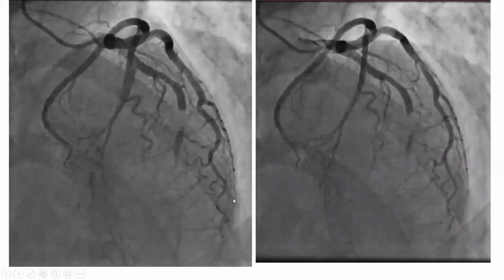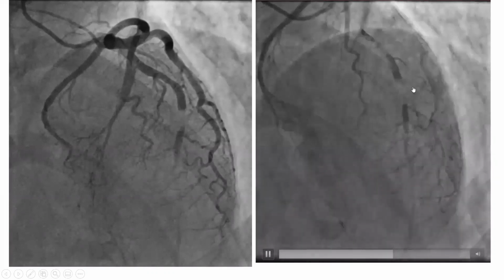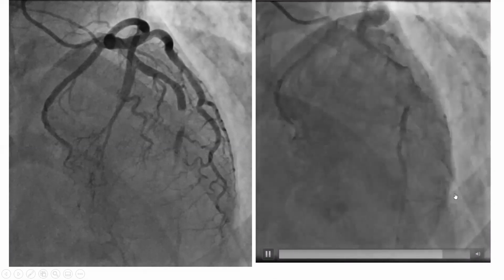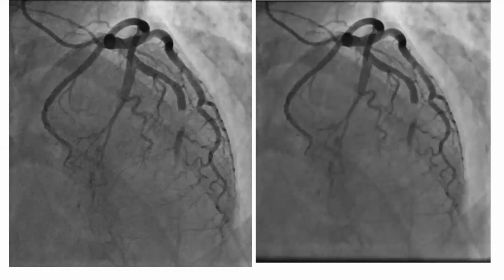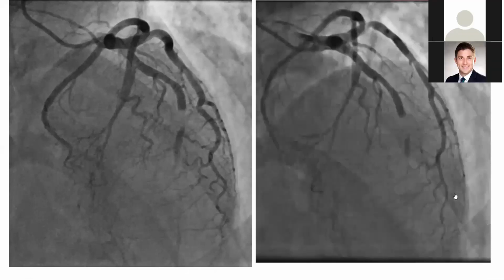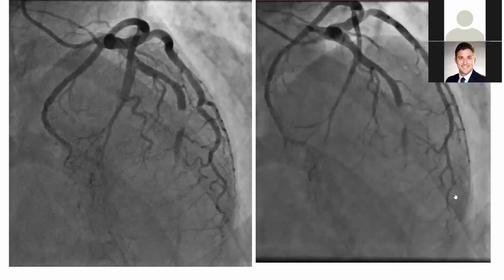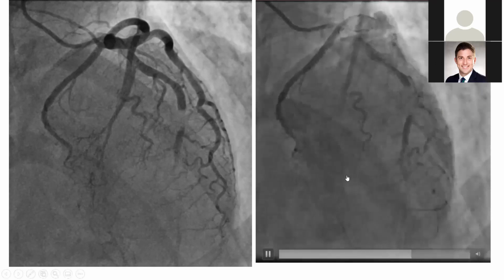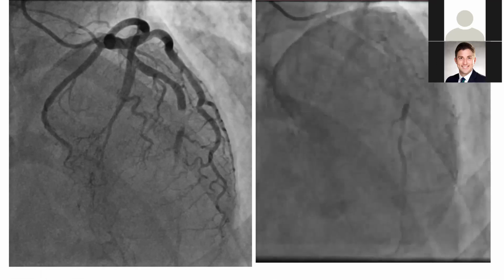Now, you will see this is as bad of a Wellens as you can see, that mid-LAD is subtotally occluded. You have TIMI 2 flow. It still has a flow. And if you go to the original publication by Wellens, 18% of those patients had total LAD occlusion. Yet again, I don't believe a cath is urgent, and it's not recommended for it to be urgent as long as she is chest pain free and no ongoing ST depression or ST elevation. She underwent stent and she did fine. Actually, her apex has recovered at 1 month echocardiography.